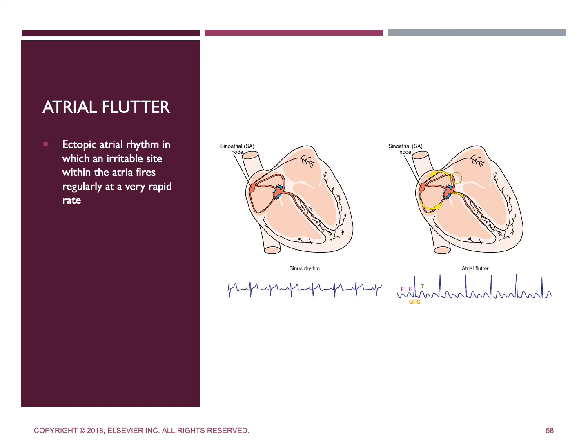Now, with atypical atrial flutter, that impulse circulates in a clockwise direction. So this is atypical atrial flutter. It's now going to go clockwise, where typical atrial flutter was counterclockwise. So with atypical atrial flutter, the impulse is going to circulate in a clockwise direction. And what that's going to result in is F waves that are going to be predominantly positive in leads 2, 3, and aVF and negative in V1.